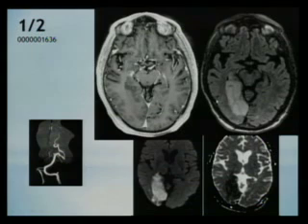Infarction, acute, subacute, and chronic. The acute infarct can easily be recognized by the fact that it has restricted diffusion, bright on diffusion, dark on ADC. This has already been of a certain length of time because it's already bright on FLAIR, but not long enough to cause enhancement.